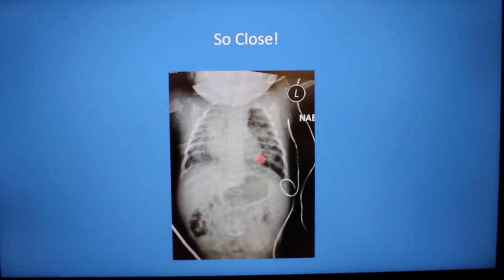However, what we're looking for in this particular patient was an aspiration. And as we said before, aspirations usually show up in the right side, right about here. This structure here is the baby laying on his high flow tubing. So everything was off the front of the baby, but the nurse hadn't swept underneath the baby to see if the baby was lying on anything. So this tubing was exactly across where we were looking.